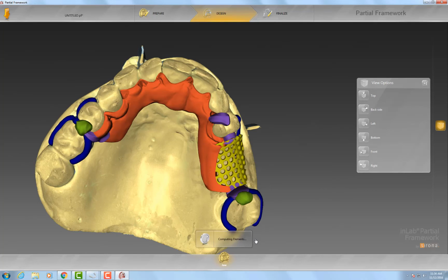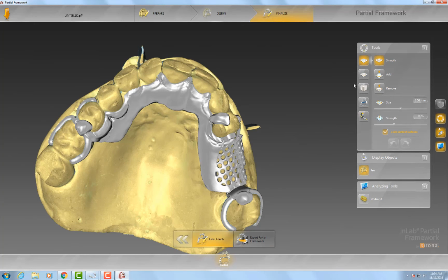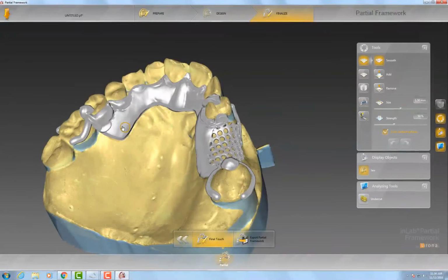So now that you see that everything is bridged, everything is done, we actually have some other tools in here. What I like to do is I like to go back in and just make everything a really nice, smooth pattern. Because when you have complexity in your designs, you're going to have complexity in your castings. You can also add stippling and all that other stuff, but for demonstration purposes, I'm just going to kind of get this right about kind of where I want it.